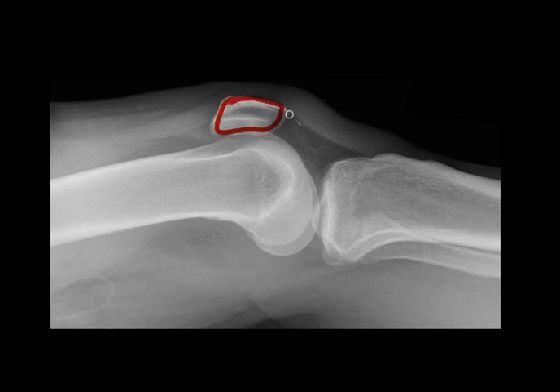So now look at this distance, which should be the length of the patella plus or minus 20% of the patellar length. If this distance increases when the patella is in an abnormally high position, this may indicate the rupture of the patellar tendon, and this should be excluded.